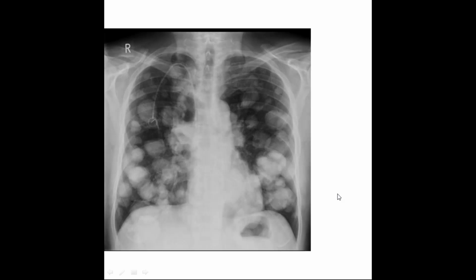So cannonball, nothing much in this. Common malignancies having cannonball metastasis, two or three examples. Renal is good. RCC has a very common cannonball appearance. Anything else? Choriocarcinoma or adrenal, I'm again not sure. I would say renal, yes. Choriocarcinoma, yes. Ovarian also can do that.